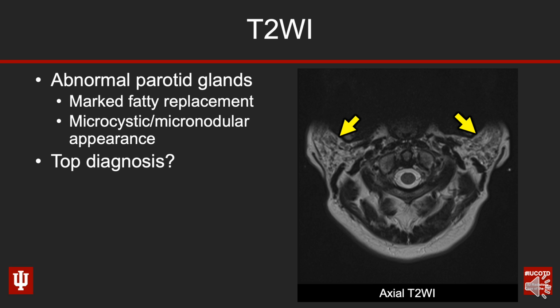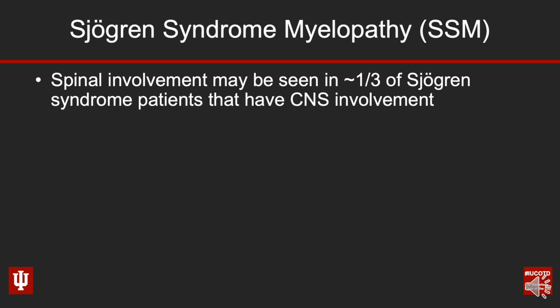So put it all together. What's your top diagnosis in this case? The diagnosis we suggested as this patient was scanned in the ER and was confirmed later by serology. Okay, this is a case of Sjögren syndrome myelopathy, or SSM.